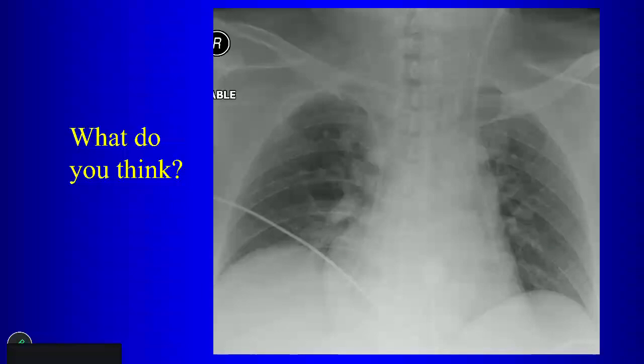Might be a persistent cava by chance, or not sure what it is. Or actually no, it could be going through one of the arteries of the arch and coursing down to the descending aorta.